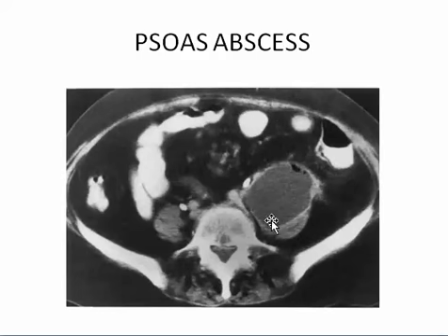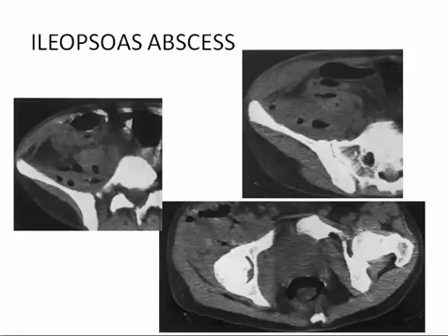Psoas normal, psoas abnormal, is large, filled with fluid and containing air, so this is a psoas abscess. The psoas abscess or iliopsoas abscess extends downward to involve the iliopsoas muscle and fascia, and may extend forward through the inguinal canal to fill in front of the upper part of the thigh, proximal thigh. So this part is the same, this is extension of this.